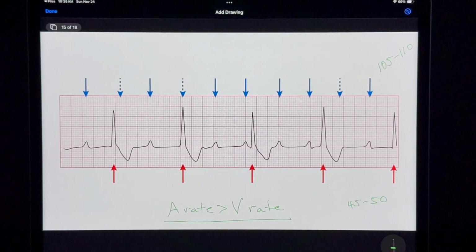In this ECG, the QRS complex is wide, indicating that the ventricular rhythm originates from a site in the ventricle. If the QRS is narrow, it originates from the AV junction, which is the junction between the atria and the ventricles. It is often said that the P waves are marching through the QRS complexes. It is also described as AV dissociation, which is the lack of relationship between atrial and ventricular activity.